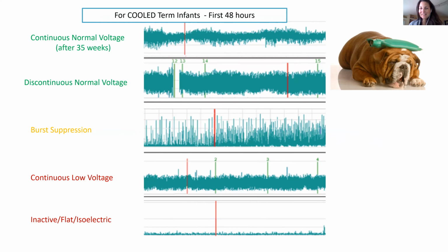Yeah, lower voltage. It's actually quite suppressing, Versed. The kids I've seen monitored with it, you're pretty much seeing a low voltage pattern. You almost suppress out the upper limits.